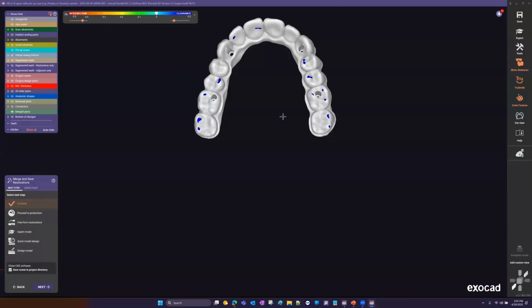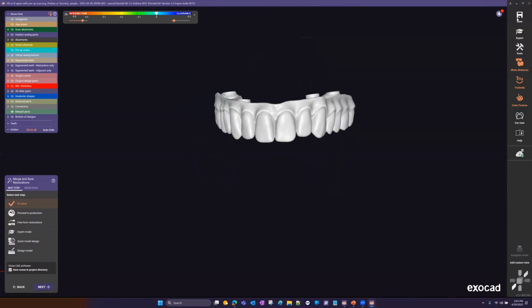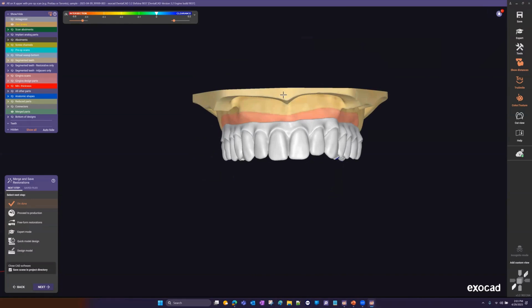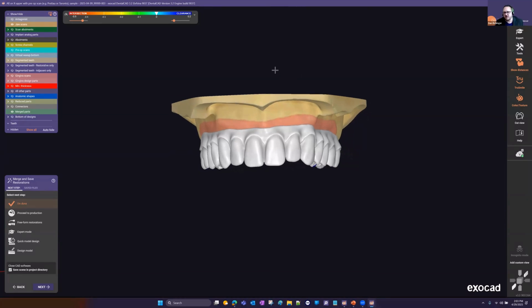Let's see. So Jim wants to know, and no question is dumb, Jim, you know that. Can you scan with a 3Shape desktop scanner? Yeah, so our software is completely open source. Any PLY, OBJ, STL file is fully usable in our software.